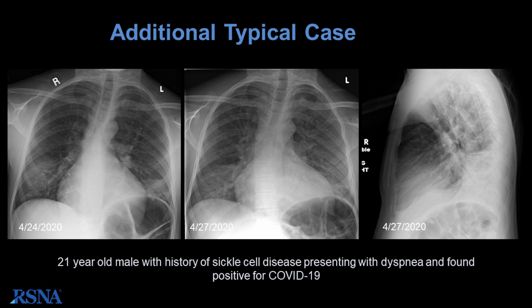Next, we're going to talk about the chest CT findings for pediatric COVID-19. As one might expect, based on what we talked about in the radiograph section, the distribution is the same. We see bilateral ground glass and consolidative opacities, which tend to have a peripheral and lower predominance. One thing on CT we can see better is the more subpleural lesions. Another thing that can be seen on CT in pediatric patients is the presence of the halo sign, which is seen in early cases and hasn't been described in the adult literature.